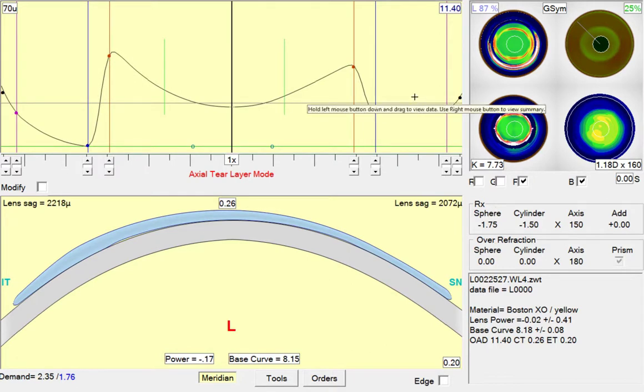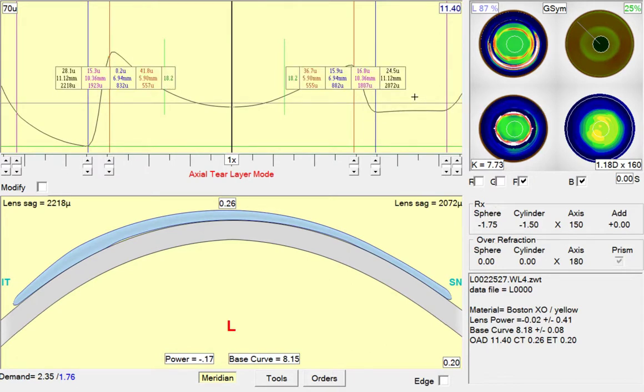So in this one, we want to make the lens a little bit flatter. We want to decrease the sag. And again, I think we can leave the pink alone, or maybe decrease that a little bit. So we go 15 here. Let's decrease by 7 here. So our new targets will be 787 and 1800.